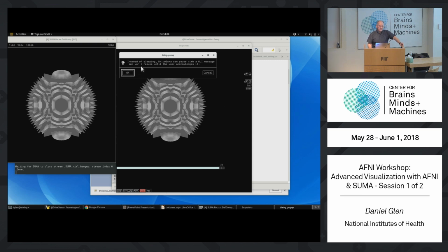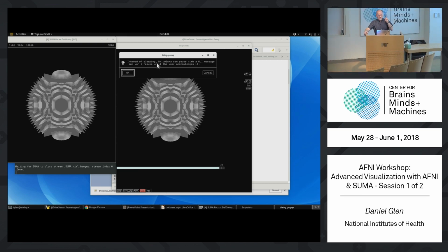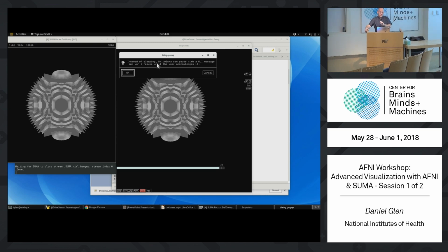So Daniel, all of these drives start. Yeah, so this is the bug I found out last night about this. It looks like it's just sitting there. The prompt has happened, but for some reason, the window is a single line.